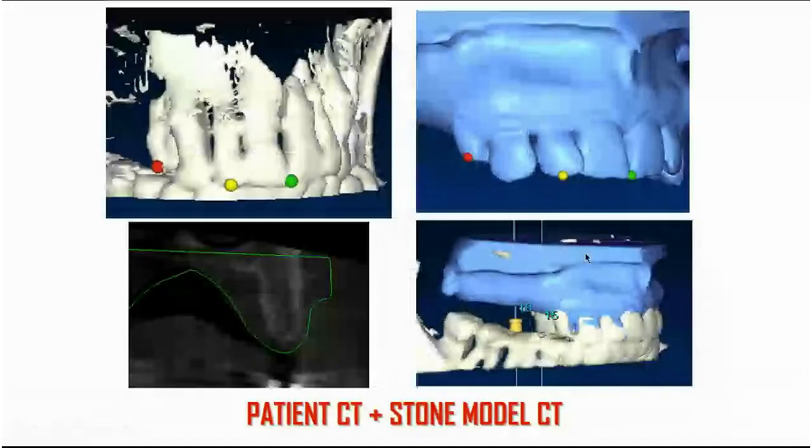So what do we do? We recognize certain anatomical landmarks in our CT. We follow a procedure in the software where we add these dots on anatomical parts which we recognize as similar. Then the computer will calculate whether we have an acceptable error.